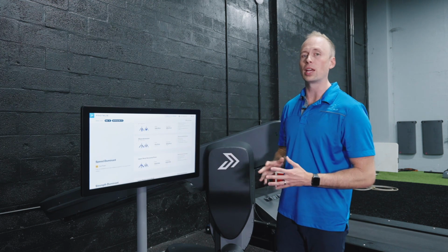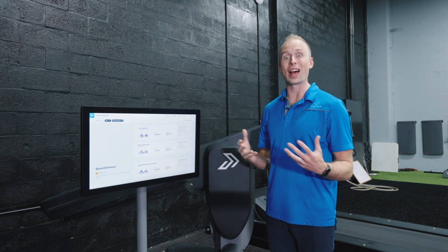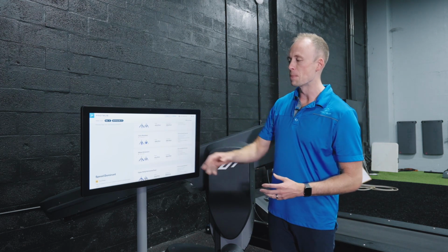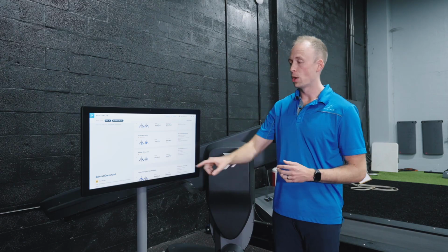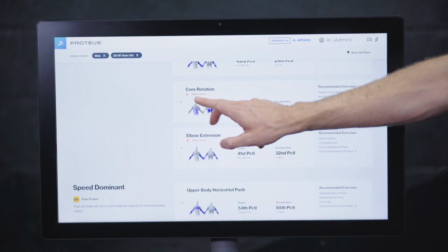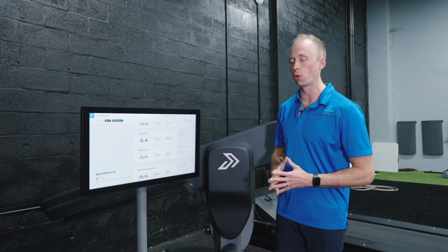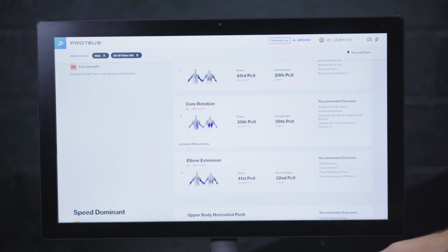But there's a couple other things that you can do in this section that will provide a lot of interesting information. For one thing, if you do an exercise on the left and the right, and there's a big imbalance between the two, we're going to call that out by flagging that movement category as having an imbalance. You'll see that in that little red indicator there. And you can always expand these cards to get a little bit more detail.